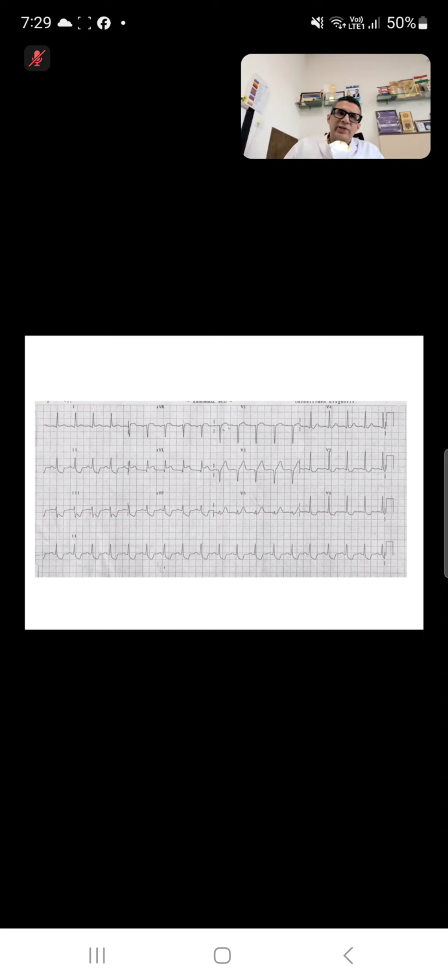Yes, sir. As he told, it is indicative of myocardial infarction with reciprocal changes. Again, sir, it can be inferior wall NSTEMI also, possible, sir. The second possibility is there is an inferior wall ischemia. So there are two areas which are having ischemia. So one is anterior wall has developed STEMI and inferior wall is developing ischemia. The other important thing you should remember is ischemia at a distance.